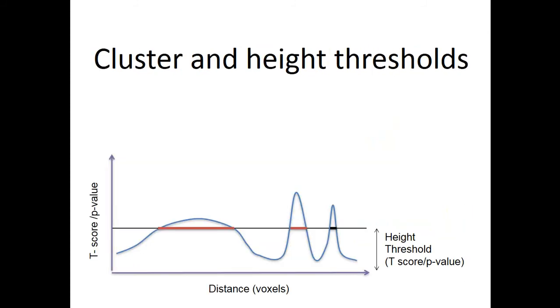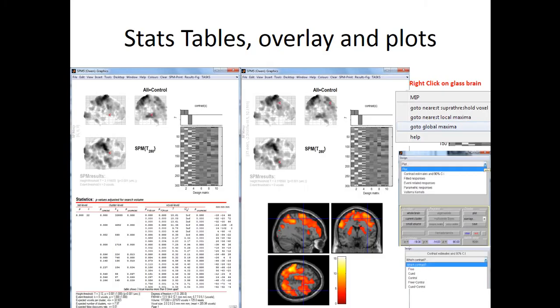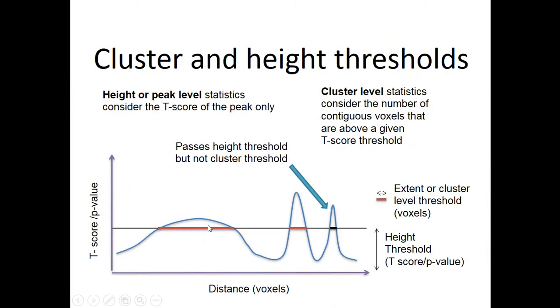This is the glass brain. So this is just explaining cluster correction again. If you think about a T map as an undulating mountain range, we have some regions that are very low amplitude but have a very large spatial extent, some that are very high amplitude but relatively narrow, and then there are other ones. So set level would just say there are 3 peaks crossing my threshold. This would be the uncorrected threshold we'd set. Is that significant? Would I expect that to happen by chance?